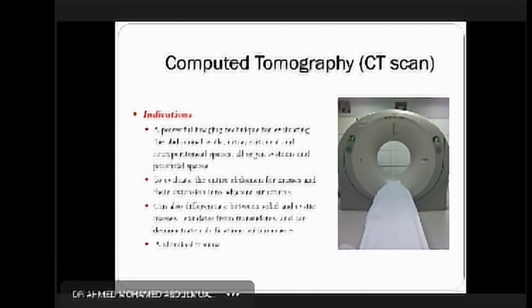So that's why CT is a very good tool, and CT is the best modality to show the normal anatomy of the abdominal organs. So you can see all the detail of the abdomen, all the organs, and the deep structures can easily be seen in CT scan with high resolution compared to the ultrasound, which sometimes cannot be seen due to the bowel shadow. Okay, so CT is the best to show all the detail of the abdomen and the anatomy. And when you go to the CT scan room, you'll see the anatomy of the abdomen nicely, easily seen in CT scan of the abdomen.